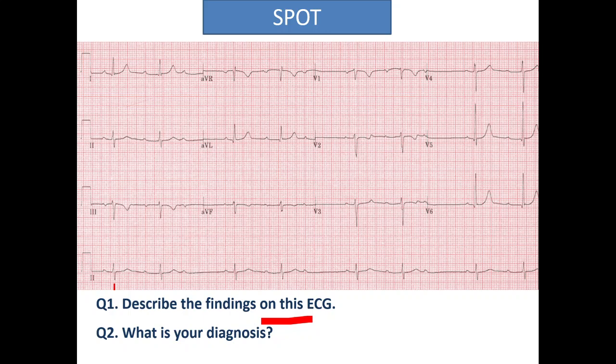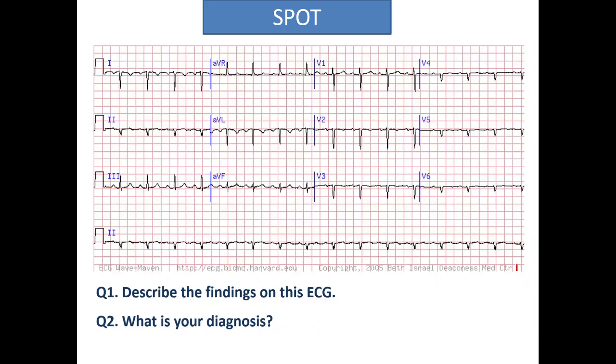I hope many of you might have got the diagnosis. Those who didn't pick the diagnosis, pause the video, try to focus, and I am going to tell which are the areas to focus on. Pause the video and try to find the answer. Take a focus on this long lead 2. Look at the P waves. What is happening to the PR interval? So I hope now you have found it. Heart block, what degree and all, you study it out.